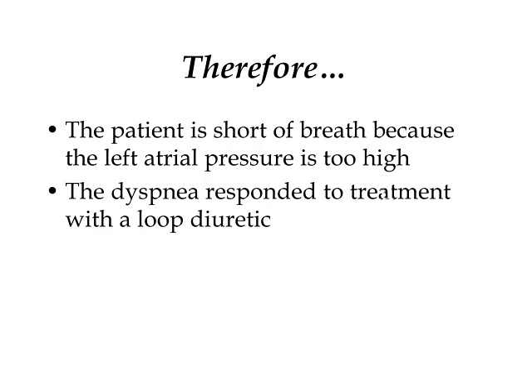So if you could infer the presence of congestive heart failure from the image of the ventricle itself and the poor systolic function, and if you could infer it from the deceleration time of the E waves and the pulse wave Dopplers of the mitral valve, you've now proven it using a combination of the IVC morphology and the velocities of the flow from the LA to the RA. And this patient responded, as you would expect, to treatment with diuretics.